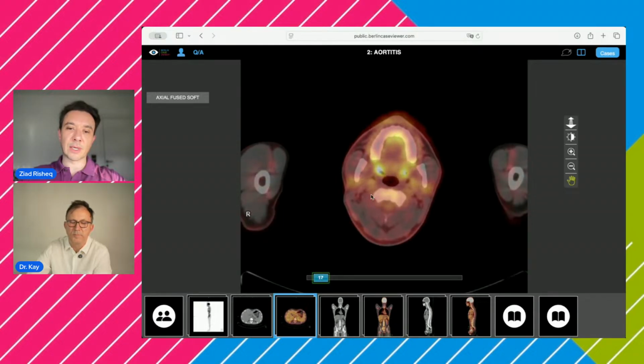If you need soft tissue characterization, you need MR. So I cannot 100% exclude disease involvement. For example, if this was sarcoidosis, I cannot exclude with 100% that the parotid glands are not involved if they are not showing uptake. Most likely they're not, but you need MR in these cases.